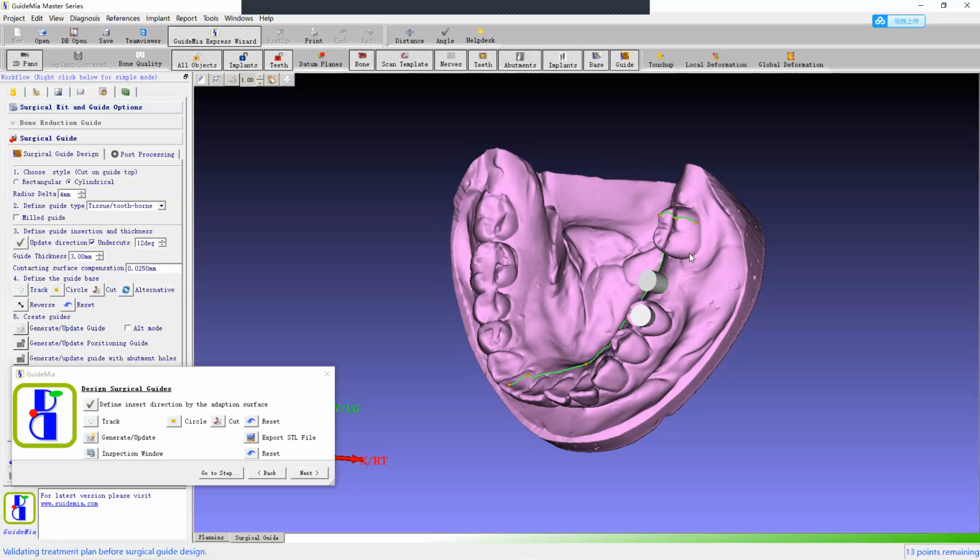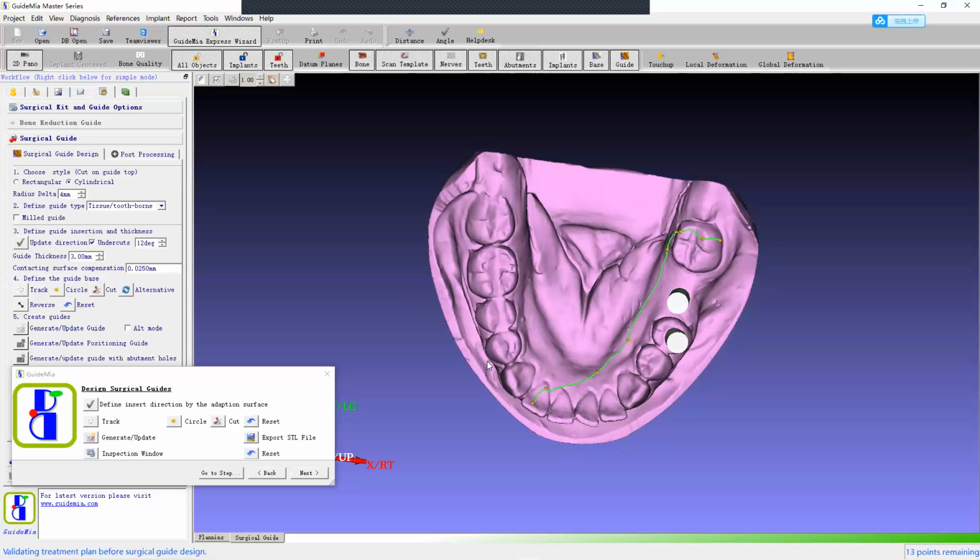He said 2 out of 3 cases didn't fit in the patient's mouth, so he ended up modifying the guide. If you modify the guide, you don't really know if it's right or not. You only know it sits on the patient, but it could be in the wrong location. So we wouldn't do full arch unless we are sure the scan is good.